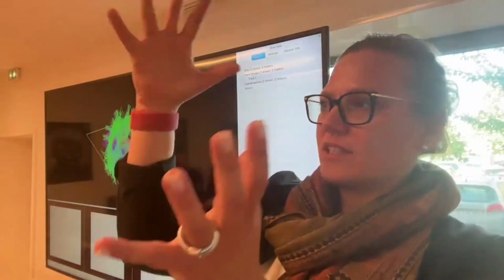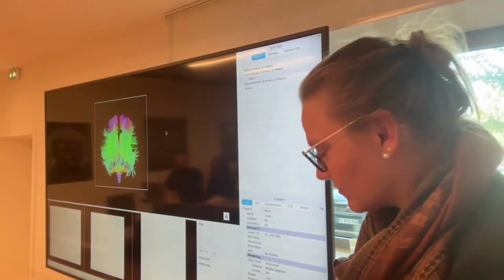Now, what you can do in the top window is you can grab it and rotate it. It takes a while to get your orientation. So if you end up in a tilted orientation, you can't go back. You can just right click or control click and reset the screen. The other thing that might happen is that you're too enthusiastic and this happens. That's just double clicking on the screen. So you can always make it big and small.